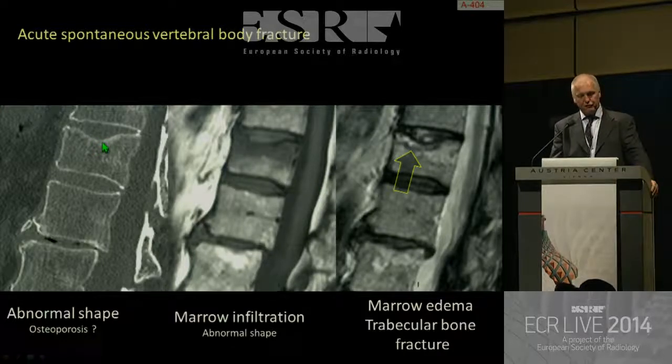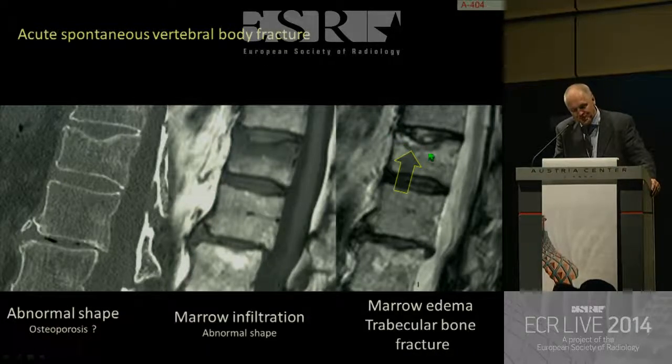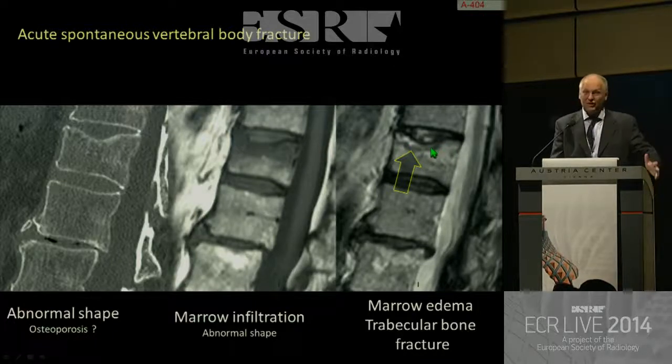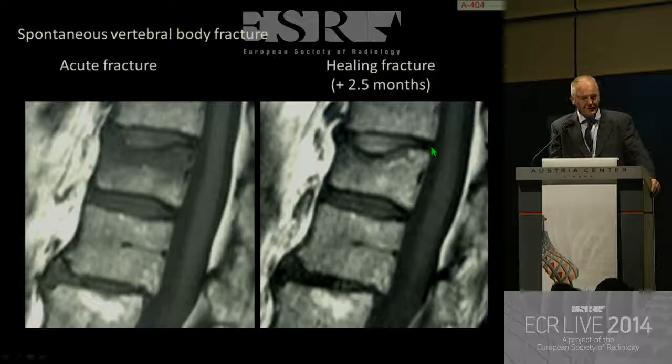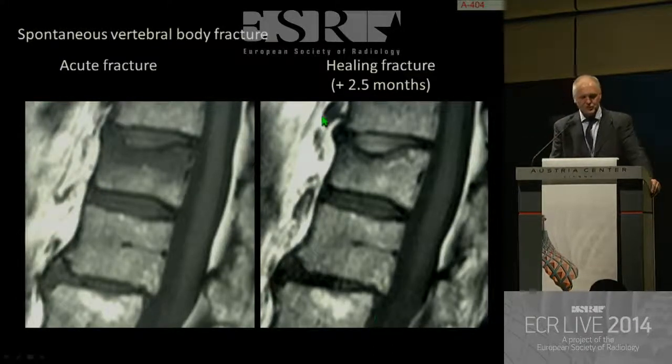We have seen the deformity. You will have to search actively, not on axial images, obviously. You look for the impaction fracture where it is visible, occasionally on T2, occasionally on T1, occasionally on enhanced T1 weighted images. You look for a line which indicates the fracture. As a rule, all of these benign fractures must heal within 3 months. Therefore, if you do follow-up, in this case at 2.5 months, there is a significant regression of the abnormality on the T1.